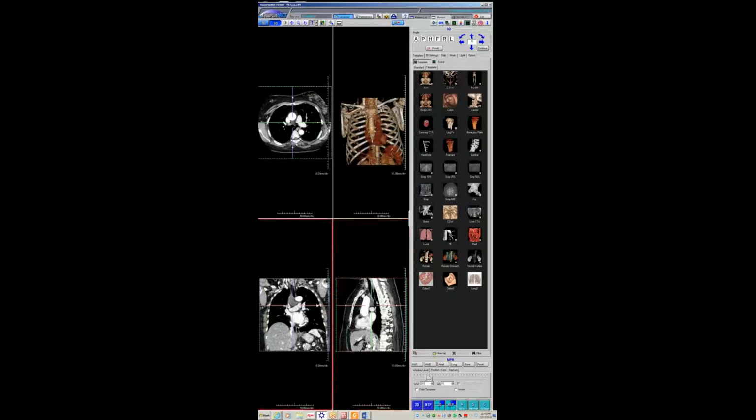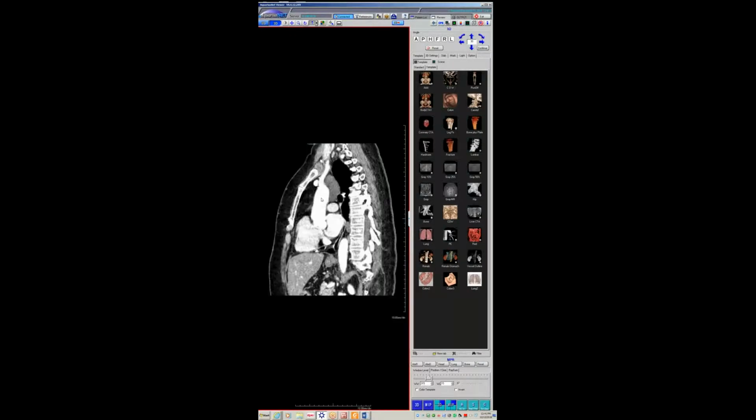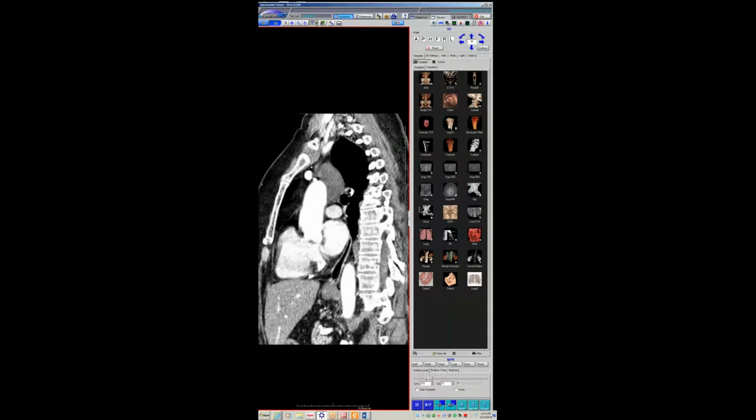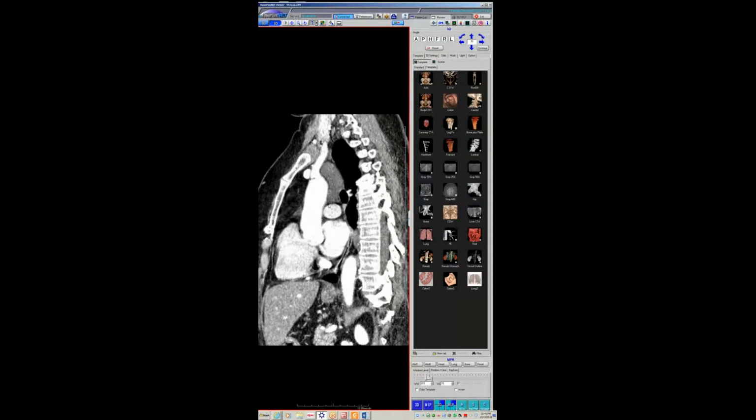This has been there for a long time. I have another study. And you can see here that, because of its location down here, it's clearly intrapericardial. So this is a high-riding superior aortic recess. You get these high-riding recesses that can get filled with fluid. We see fluid in the superior aortic recess all the time.